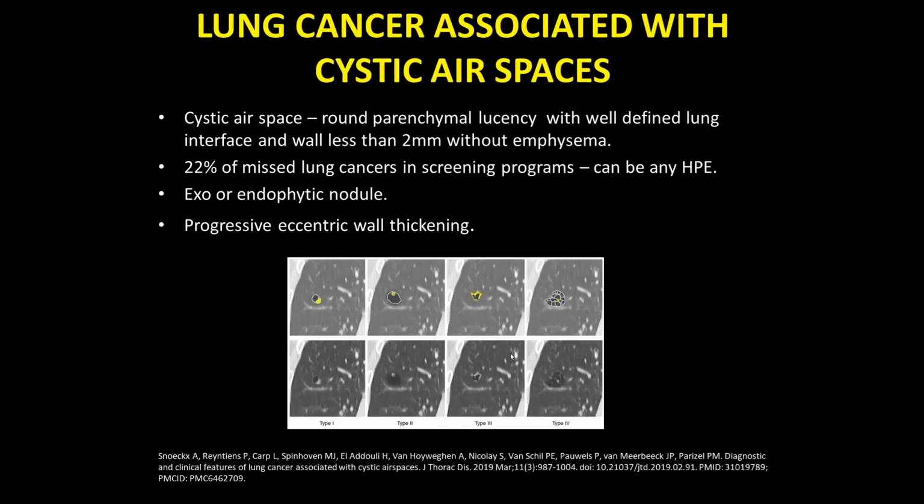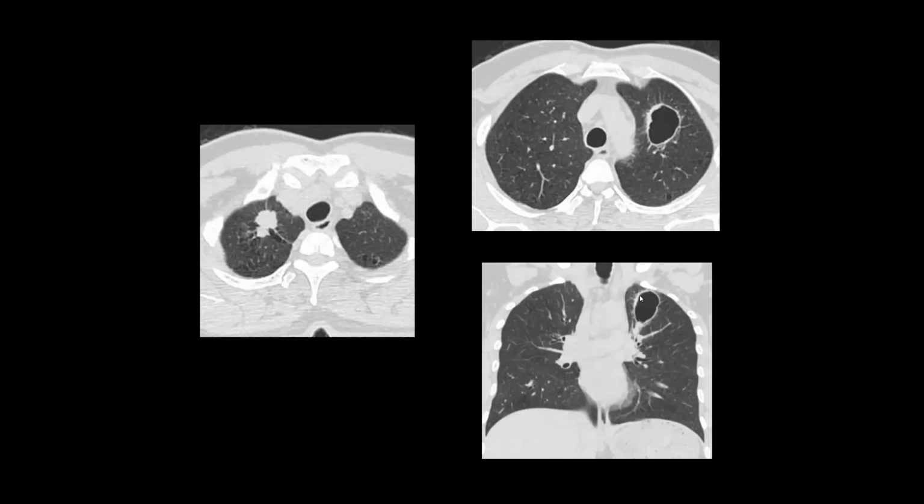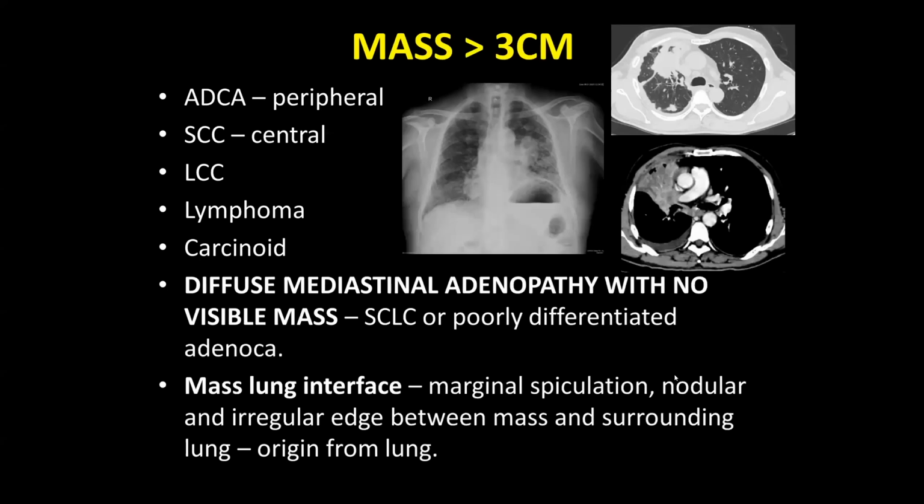The interesting thing is we did the MRI for this patient, and we found that this part of the wall was actually showing nice diffusion restriction. So that makes it even more worrisome. Okay, that was about nodules.